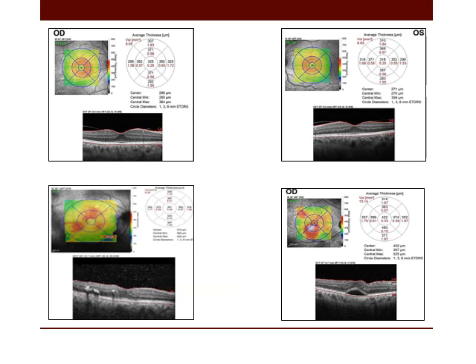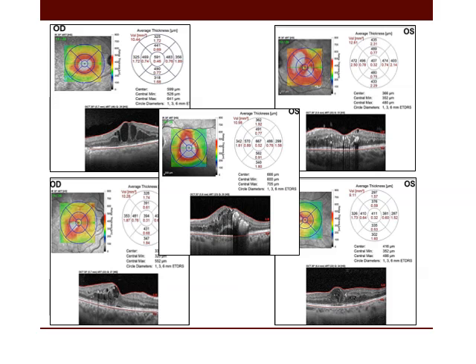Other examples for cases with diffuse spongy thickening. Again, diffuse spongy thickening, but with hard exudates encroaching on the fovea and scattered hyperreflective foci in the vitreous, maybe due to hemorrhage. Central involving diffuse spongy thickening. Central involving diffuse thickening with foveal serous retinal detachment or central serous retinal detachment.